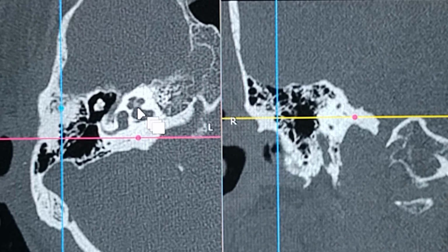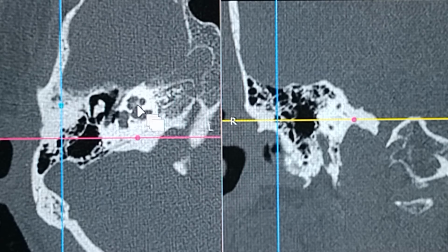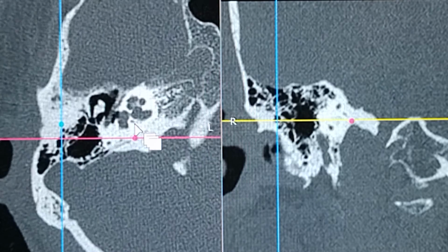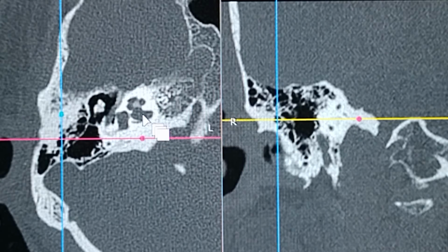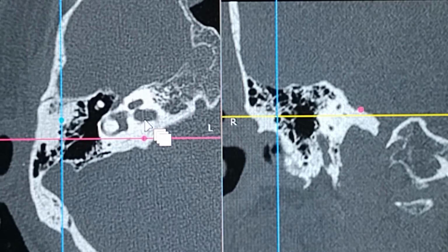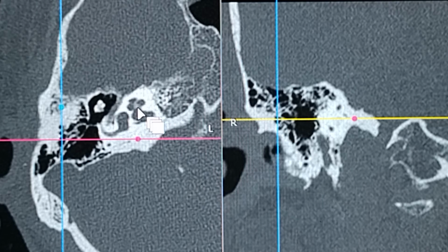That's the cochlear nerve. And you can see a very faint fracture line over here, which is going into the vestibule. Now this is still cochlea, right? So we can assume this is the cochlear nerve. That's the IAC glimpse, the very lateral part of the IAC. You can just focus on this faint crack-like structure which is going into the vestibule. Let me come back and show it to you again. See, this is the IAC. If I keep on going above, that's the IAC. Now let me see the cochlea. Now that's the cochlea, so that's the cochlear nerve. So the anterior inferior content is done.